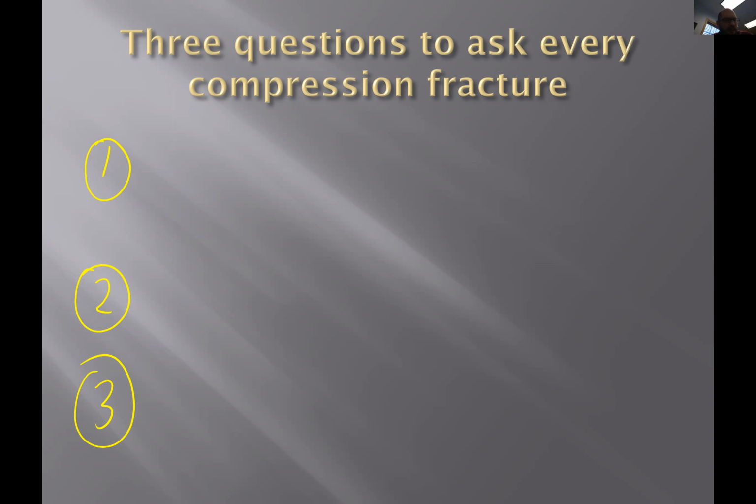So, look, if you're busy, and I know many of you are very busy, you know good and well that you are looking at compression fractures every week. Yes, some of them are old, some of them are this, some of them are that. Not a big deal. Yes, but you're looking at these, and we have to do better than just saying compression fracture. We have to ask 3 questions. Number 1, compression fracture at T8. Let me ask some questions of you.